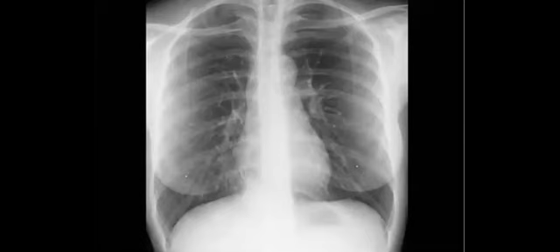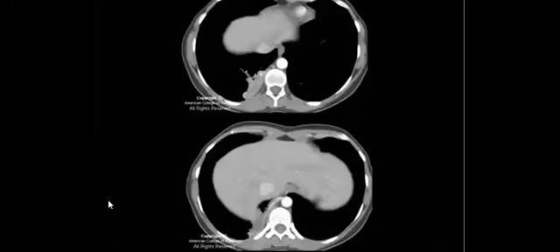Make sure that you check the previous image, if they have one. Then it can be a fat pad, maybe, but it looked like more than a fat pad, because you can see the diaphragm here, and it is lost in this area and also here. So sequestrated lung segment. It can be hernia, maybe. I agree, maybe hernia. What else? Cyst. Nice. So if I show you, Marwa, yeah, perfect, Sarah. If I show you this one, what will it be?